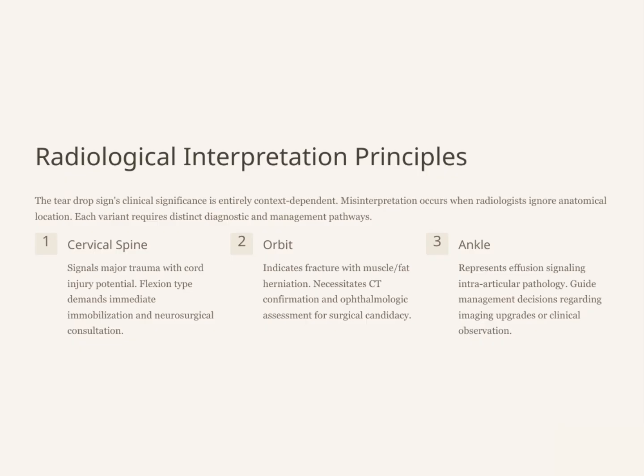So, understanding the specific location and context of the teardrop sign helps us make accurate diagnoses and choose the best treatment options. This highlights the importance of integrating anatomical knowledge with radiological findings in our practice.